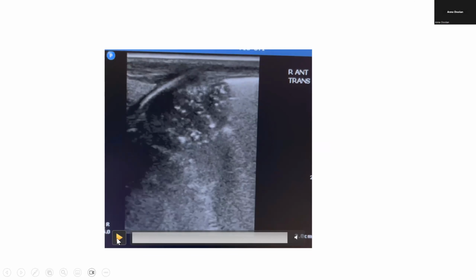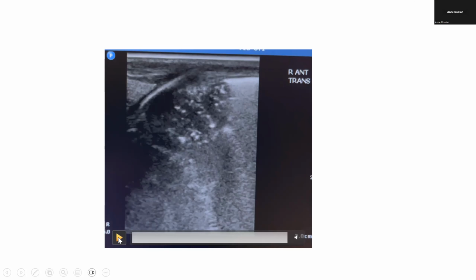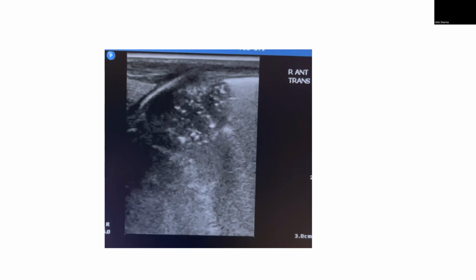Trust me, the art is in your hand. It's never in the machine. So this is somebody with a good hand. A lovely image. You can see pleura there, which is established. I would agree that you're pretty hepatized at this particular point with static air bronchograms. So, the possibility of, I would say, definite consolidation.